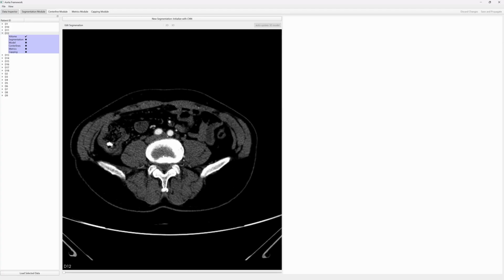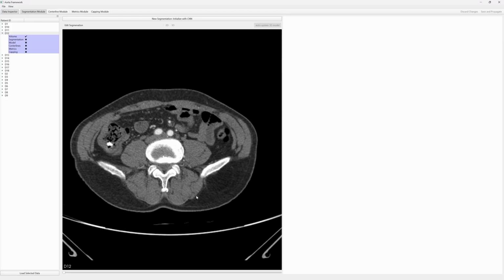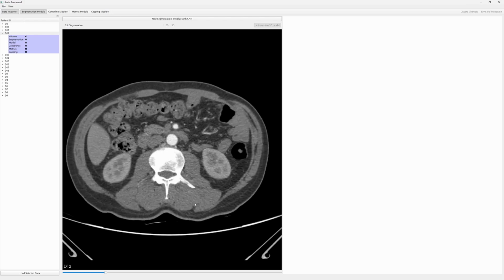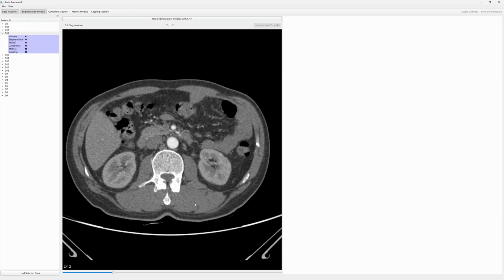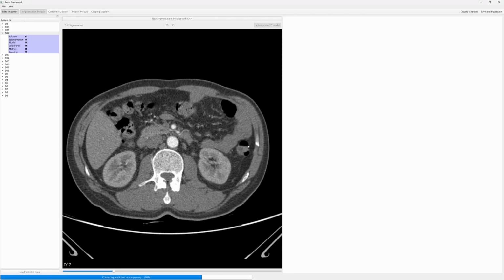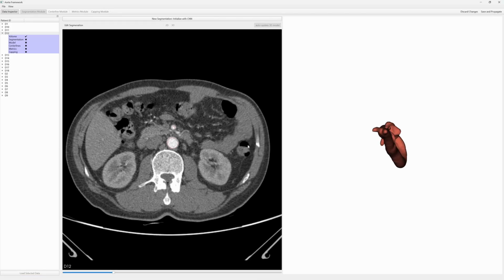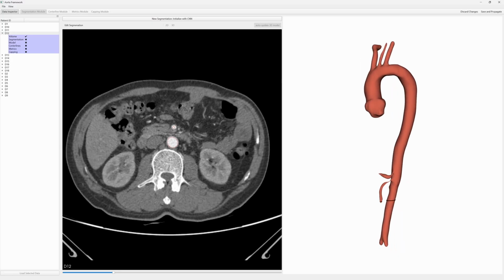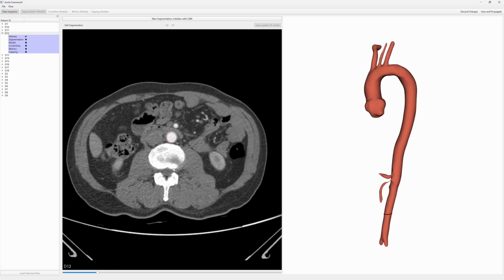To diagnose aortic diseases, physicians use CTA scans to evaluate morphology and measure vessel diameter. To extract a 3D representation of the aorta, the vessel has to be segmented. To avoid this time-consuming process, a neural network is incorporated to generate a prediction of the segmentation mask. The progress of the prediction is documented in the progress bar below. With CUDA acceleration, this process takes only about a second, and without availability about 14 seconds.